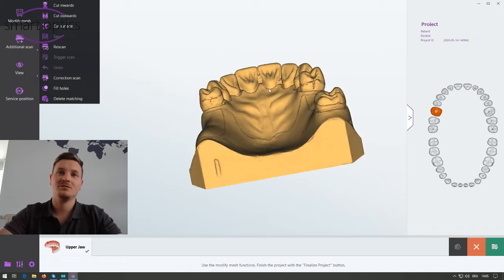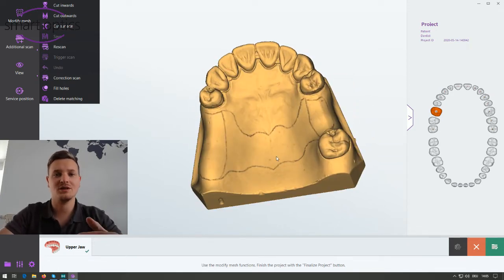And yeah, so now we could close this software, and that's the point now where I connect to Stefan Thier, and he will show you now how to design such a model or such a partial in the SilaPart software. So let's start with it.